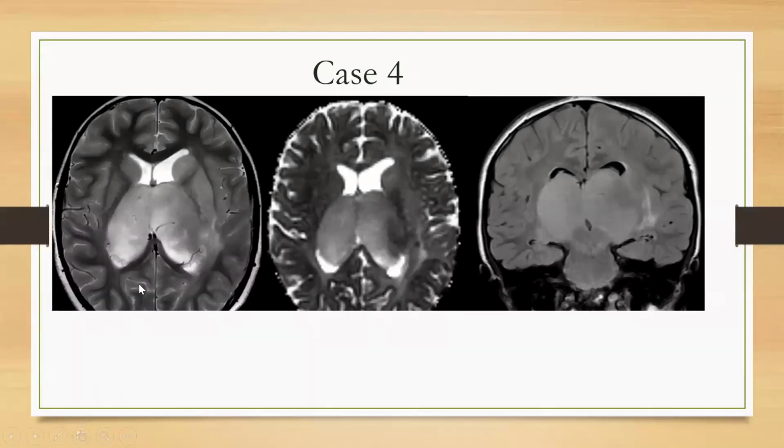Another different type of pediatric glioma is the bithalamic type of lesions we saw. We saw around 5 to 6 cases like this. In these cases, the characteristic picture is that both thalami are enlarged and very bulky, and there are some areas of diffusion restriction.